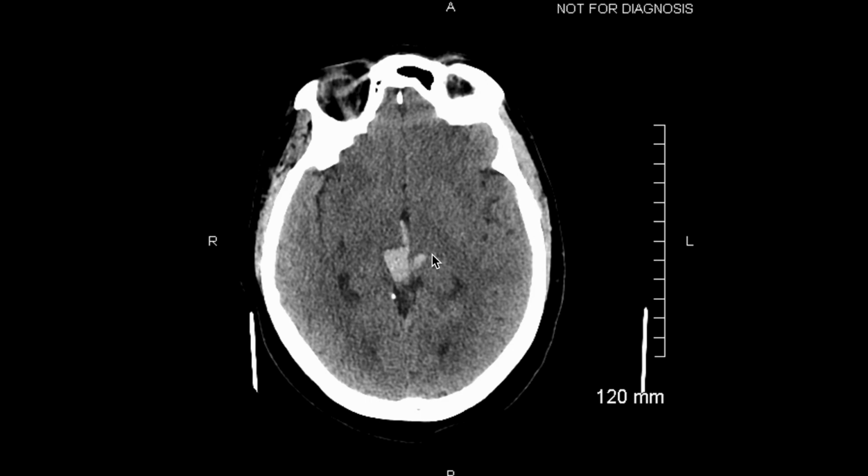Now, anytime you have intraparenchymal hemorrhage, the next thing you have to assess for is associated vasogenic edema, mass effect, herniation. So now in this situation, we have the midbrain here, but we're not able to really make out any of the basal cisterns. So there is some associated mass effect with effacement of the basal cisterns. We don't see the interpeduncular cistern, we don't see the ambient cistern, we don't see the quadrigeminal cisterns. So there is a little bit of associated mass effect.